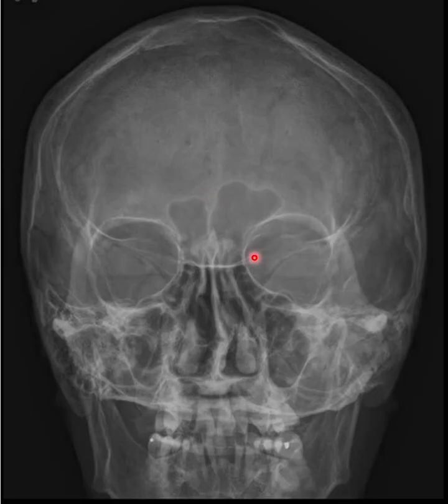In this image, I can tell that maybe the patient was unable to flex their neck enough to place the positioning line, the OML, perpendicular to the IR, and that's why the petrous ridges are not where they're supposed to be. So let's identify where the petrous ridges are here. Now on this image, the petrous ridges are a little lower than they should be. The petrous ridges should be right around here in the lower 1/3 of the orbit. So the petrous ridges should be superimposing the lower 1/3 of the orbit.